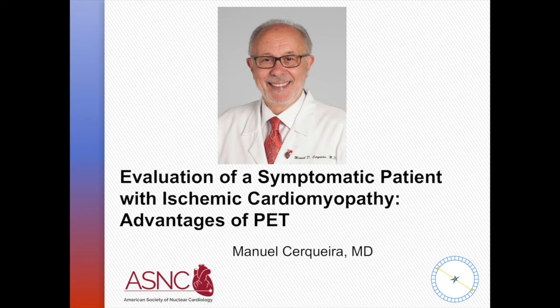So when you do PET, you usually do CT attenuation correction, and these are not diagnostic CT images, but you can certainly see calcium, and people have quantitated this as well. So it's additional information.